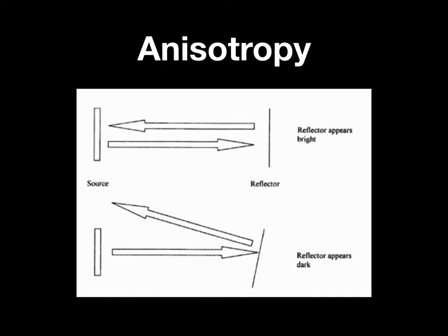The next concept I want to talk about is anisotropy. This is a key concept to understand in musculoskeletal ultrasound. Anisotropy translates to mean directionally dependent, and is a result of the fibrillar nature of structures such as tendons and nerves, and to a lesser extent muscles. This quality leads to the ultrasound image varying depending on the angle between the structures of interest and the ultrasound beam. This is also known as the angle of incidence.